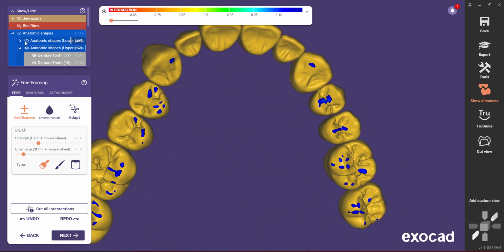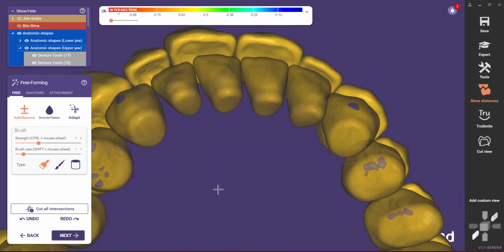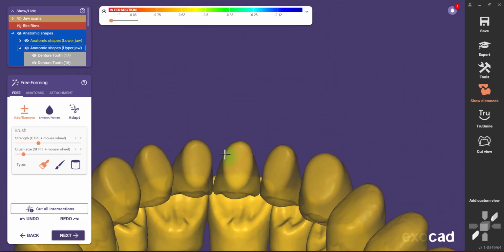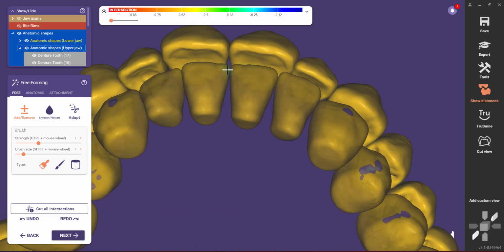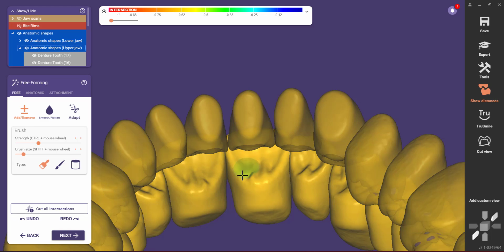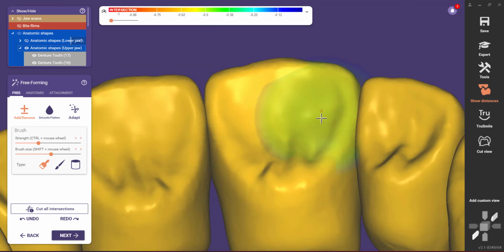All right. Now, do you want anterior tooth contact? If you do, then you're probably going to want to close some of that with your maxillary teeth, right? So maybe I come in here and bump this up on the maxillary jaw.